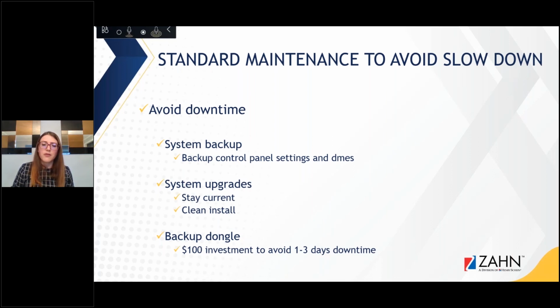And if there are implant libraries that you're not using, definitely don't import them as a just in case I need it in the future. Only import the bare minimum, only what you need. For one, it will not slow down your system by overloading it with the material information. There's less risk of the material file being corrupt, which I don't know if you run into, but that's something that happens quite often. And it doesn't take much longer for you to open up the software because it's trying to load all that information.